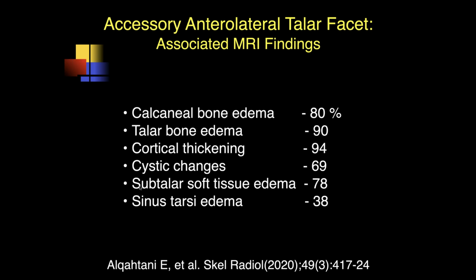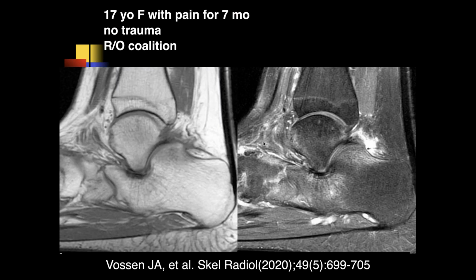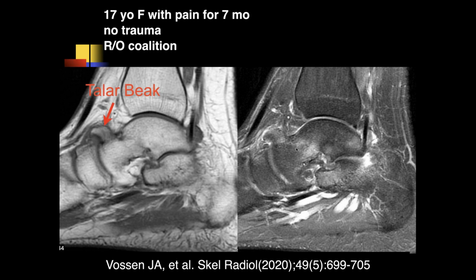It's also a very flat calcaneus, isn't it? Or am I looking... I'm not sure what you mean by that. Right image. Over here? Yes, it looks kind of flat. It certainly doesn't look normal to me. Well, what I see is I don't see a concave portion of the tail of the calcaneus inferiorly. All I see is a convexity rather than concavity.